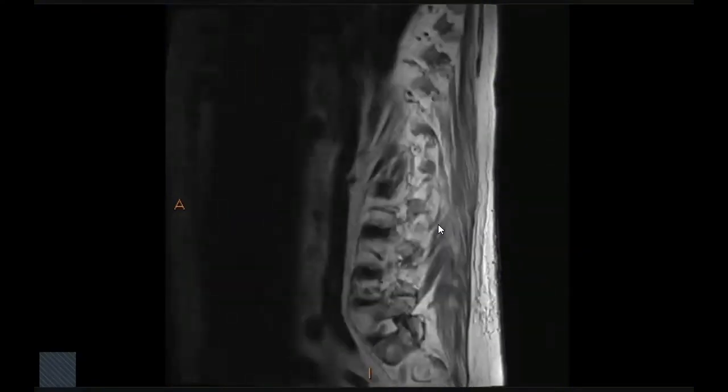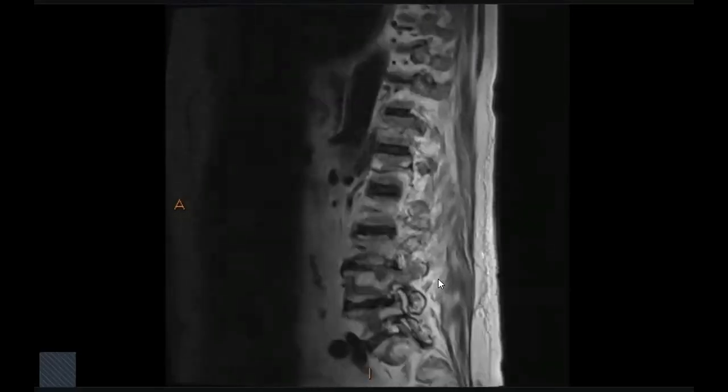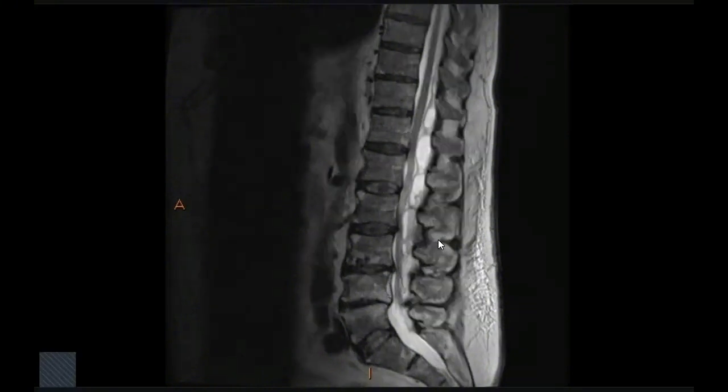Okay. Some edema within the paraspinal muscles. And so we asked for, and here also. Oh, by the way, also here, if you look at the collections, you will find an air fluid level here, because the patient is lying down. So you will find some fluid levels here.